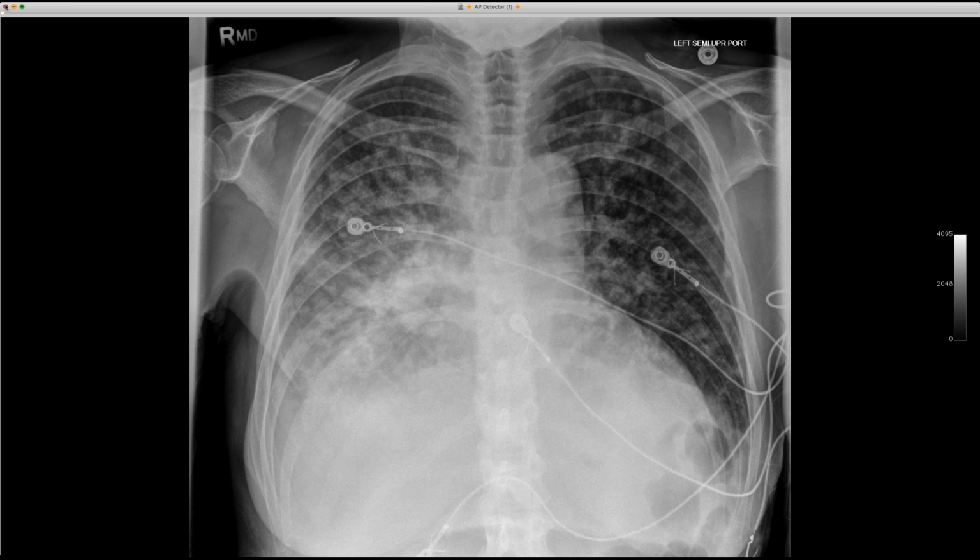Have you seen blasto with true miliary nodules? Because certainly this looks like it's a random distribution of nodules, or are they usually larger like this? In general, they are larger. That's been my experience. The disseminated fungal infection, histo too. They're a little bit bigger. But I do have one case of blasto that was a guy who developed ARDS from it. He had true miliary nodules, but he was not immune suppressed. So it's possible that you get bigger nodules in the immune suppressed patients. But it's interesting, blasto, the incidence isn't any higher in immunosuppressed patients, but they get more severe disease.